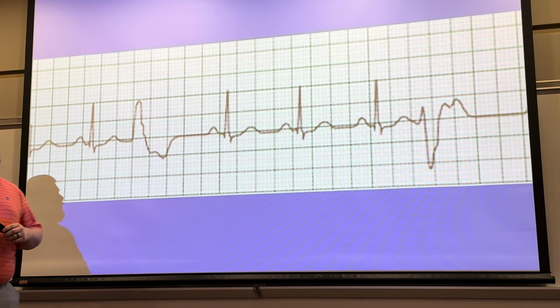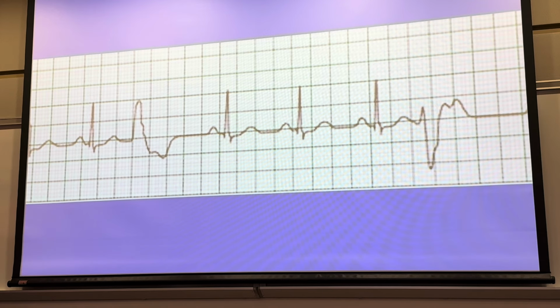Multifocal, right? Multifocal PVCs. All right, so I got a P wave, QRS, T wave. My ventricle kind of just says, I don't want to beat, so I got a PVC here, or premature ventricular complex. Got a couple normal more beats here, and then I have another PVC. But it's going in a different direction. We have a down PVC, we have an up PVC. So multifocal PVC, all right?